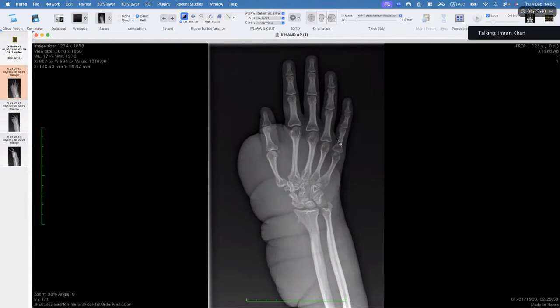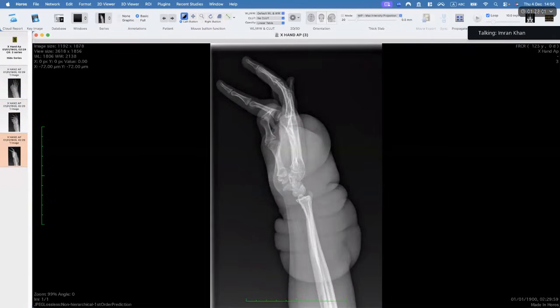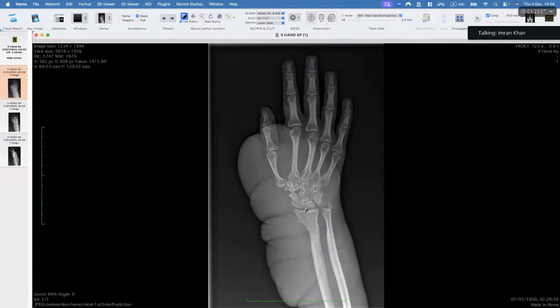If you've never seen it before, see it now and just memorize it and make sure that you never forget it. I have seen only one case when I was doing Viva, and this is the only case that I've got in my collection. This is a classic Aunt Minnie. A lot of soft tissue swelling, gracile bones with a lot of scalloping because the soft tissue has been there for a very, very long time and it's affecting the density of the bone as well as causing scalloping of the bone.